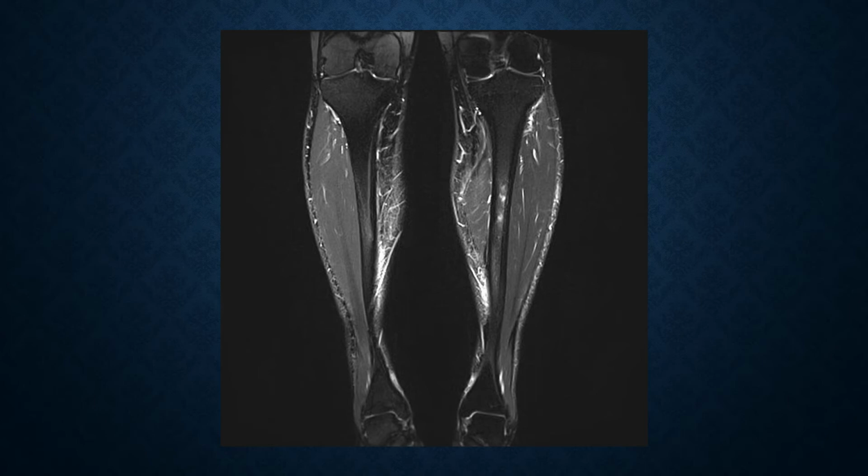Here we see medial tibial stress syndrome on both tibias, as well as some effusion that has permeated medially into the soleus medial tibial interface.